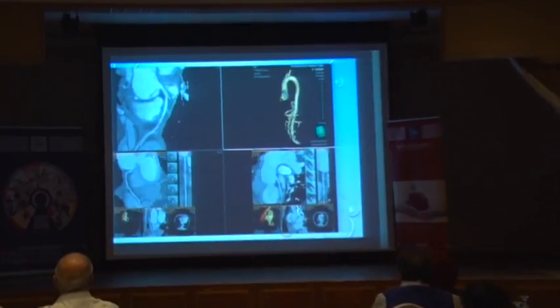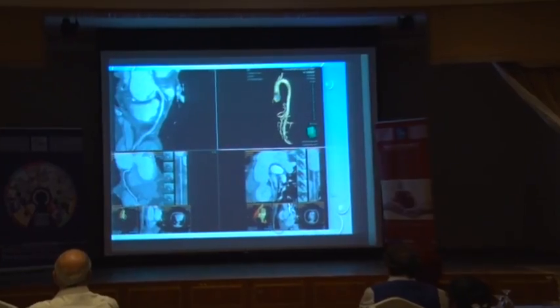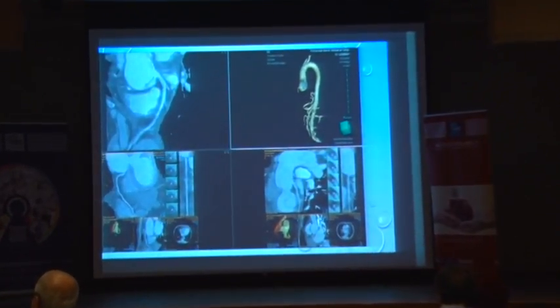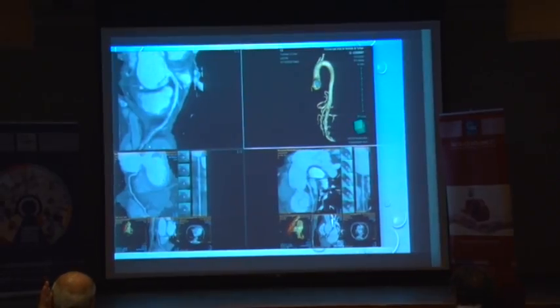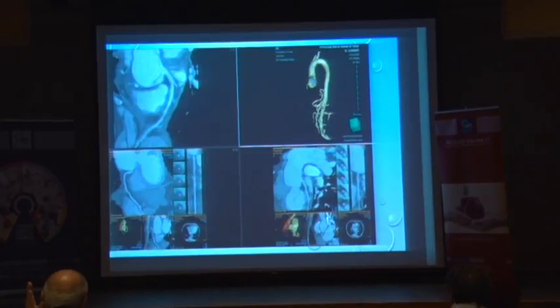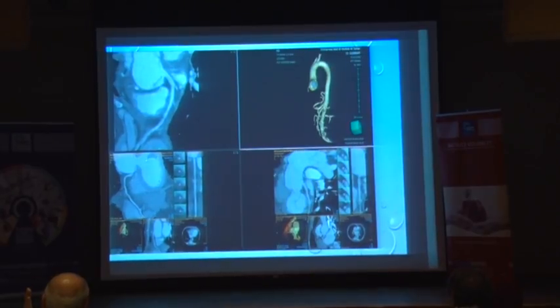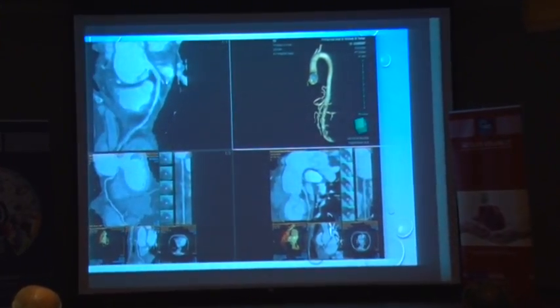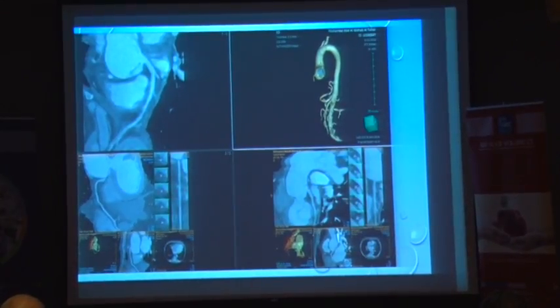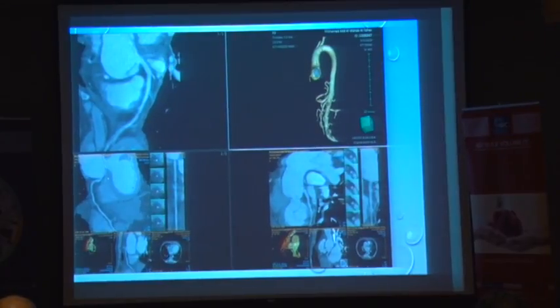So, let us continue with the second case. This patient was presenting with severe chest pain, and he had no other previous examination. And these are the type of images. So he went for cardiac ECG-gated examination. And these are the images of the coronaries after reconstruction, curved MPR. We have some software that allows us to nicely see the whole length of the coronary, as you can see. And again, in this patient, you can see that the coronaries are okay.